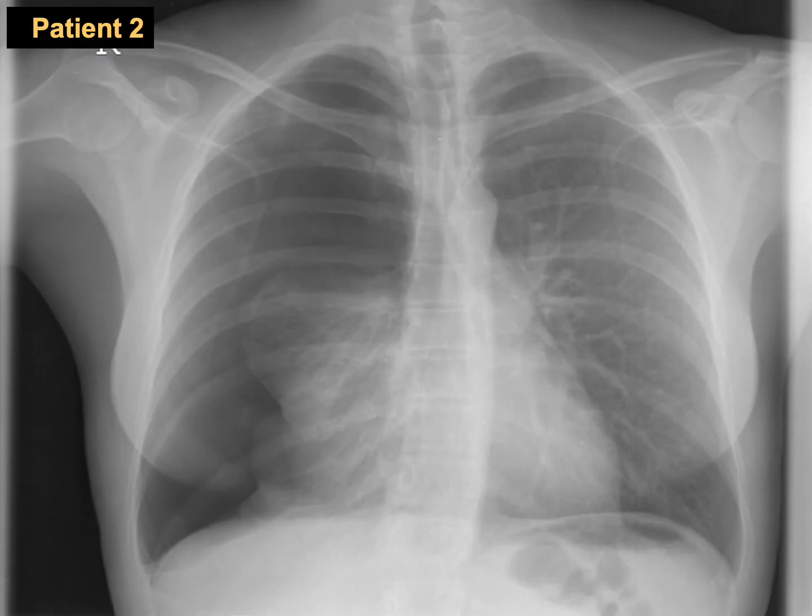Patient number two is a young female with a small stab wound above the nipple on the right side of the patient. So we're going to again go through the airway. I think you might feel it a little bit deviated to this side, maybe. And we can appreciate if the airway is in the middle or not by comparing the position of the airway or the trachea with the spines of the patient. This is the spines, as you know. So the airway, okay.